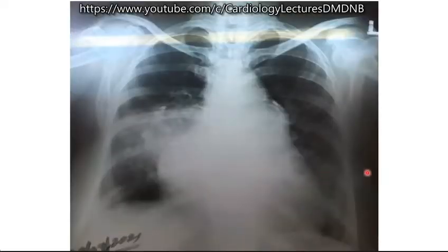Okay. Chest X-ray. So there is a calcification seen in the region of the PDA. Now, let us find out whether somebody else would like to take up the challenge. Anybody else who would like to discuss the case, discuss the X-ray? Anybody?